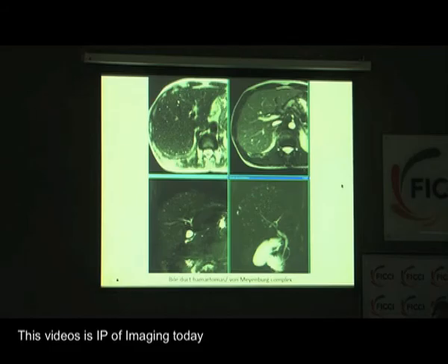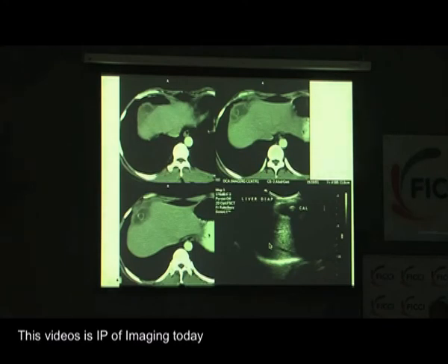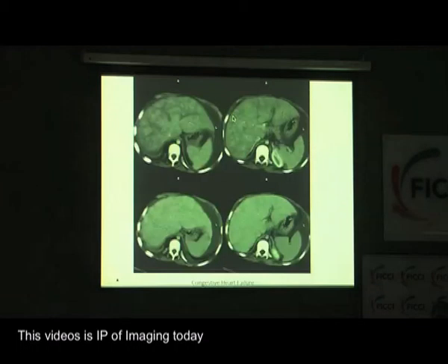This is a common condition which is the von Meyenburg complexes, which is biliary hamartomas. Here's a patient who's had a splenectomy, and on the CT there was this differentially enhancing focal lesion along segment 6 of the liver, which was actually an ectopic spleen because of splenic rest tissue in this patient with splenectomy, not to be mistaken for a focal liver lesion. And finally, this was a lesion which was actually picked up on ultrasound. It was a dropped calculus forming a perihepatic abscess.